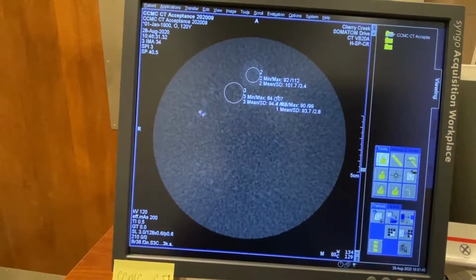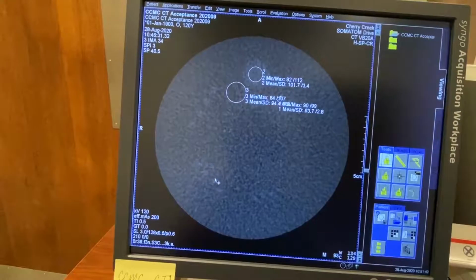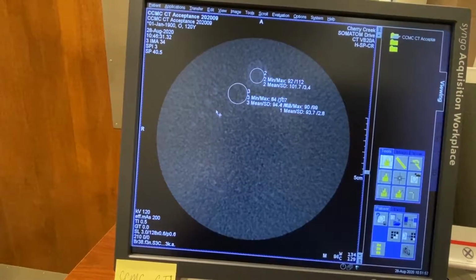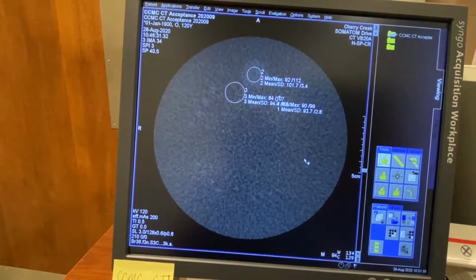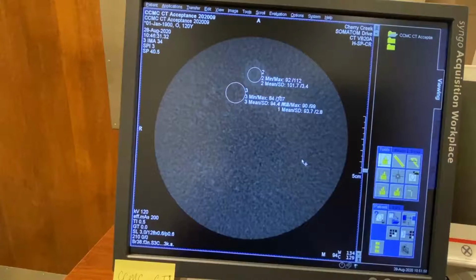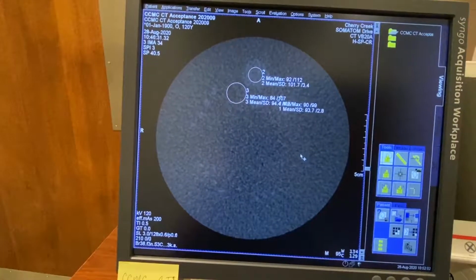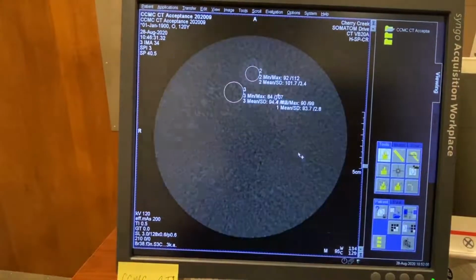And then this group of 4 small objects gets smaller and smaller. Visually you can see how many groups show up, and that indicates the noise level or the CNR performance of this protocol on the scanner.